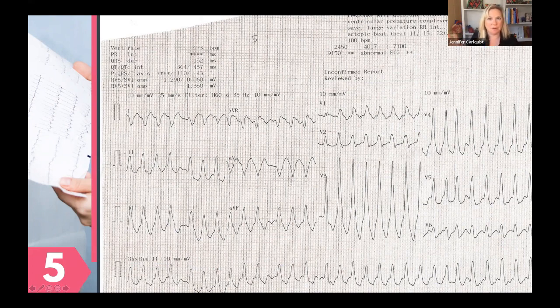Now, here are our 3 differentials, okay? VTAC, and most everybody says it's VTAC, and I see why, because if you have a fast, wide complex, VTAC should be your go-to, right? So VTAC's on the differential, so is SVT, and so is AFib with RVR.